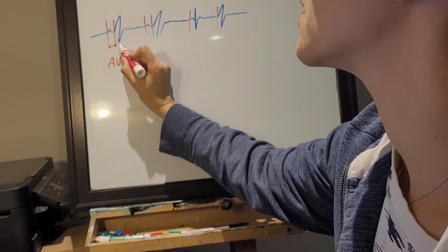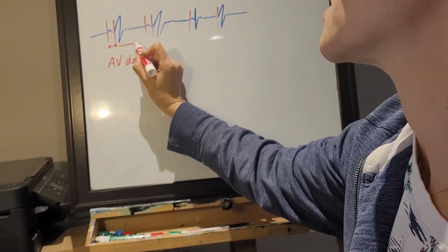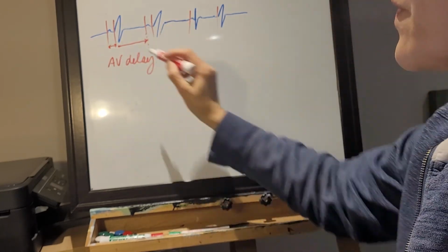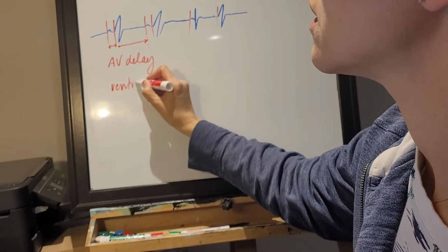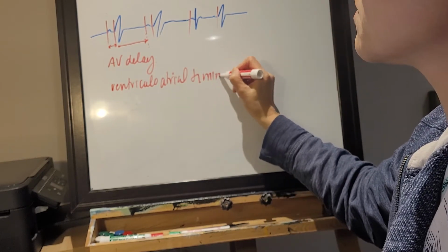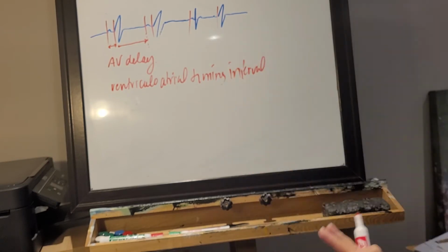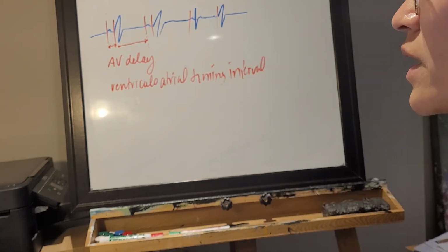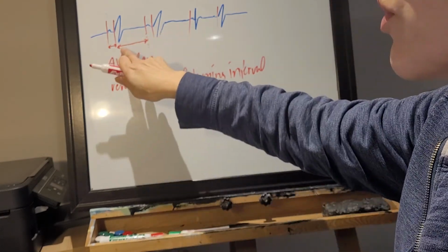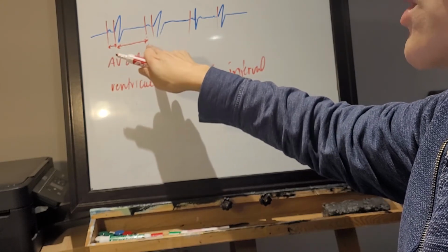Now, between this ventricular pacing spike and the next atrial pacing spike, which is this one here, that one is called the ventriculoatrial timing interval. Not totally dissimilar to the automatic interval, but specifically it is the pre-programmed timer set between ventricular pacing and then the next atrial pace.